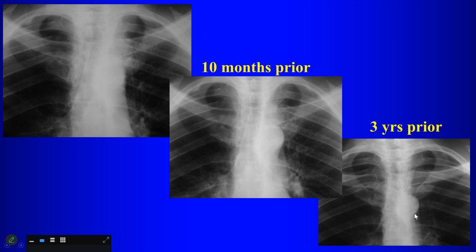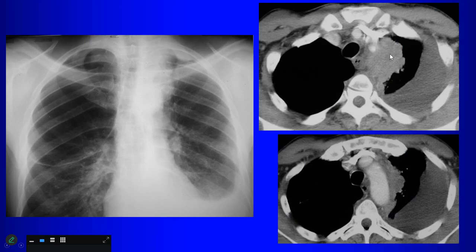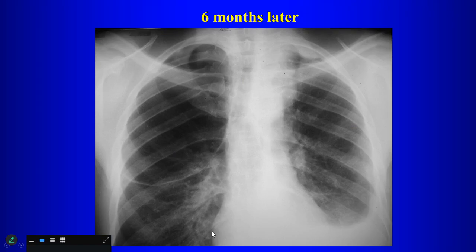Look at the aorta here. AP window's down here, right? There's something here, left paratracheal region next to the aortic knob. Okay? Big mass. Big mass up there, next to the knob, going up. And it's even worse, of course.